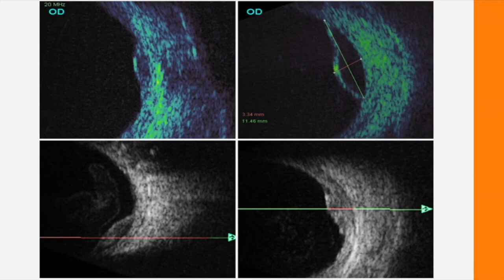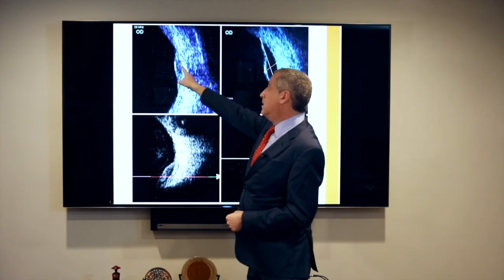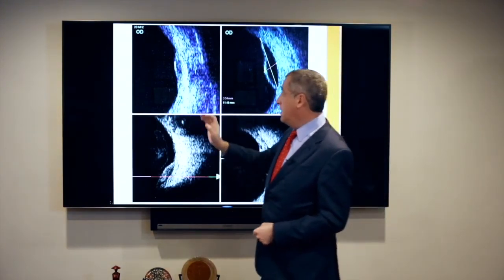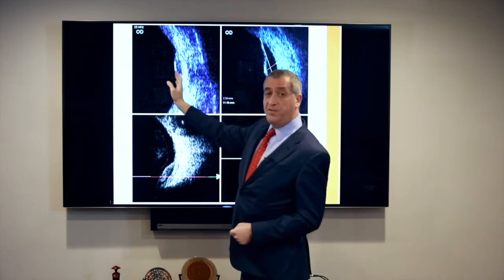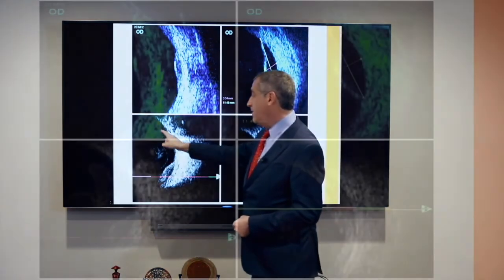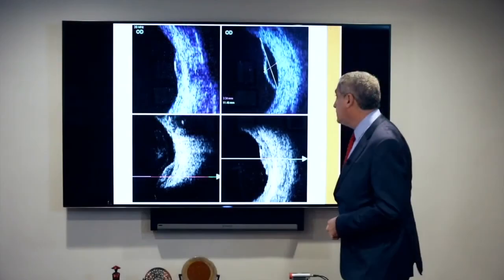One is that the tumor sclera interface is very sharp. And you can see that with a number of tumors, but you reproducibly see that with choroidal hemorrhages. Here we have vitreous blood, also a tip-off that there was bleeding. And you can see again that sharp transition between the tumor and the sclera here.